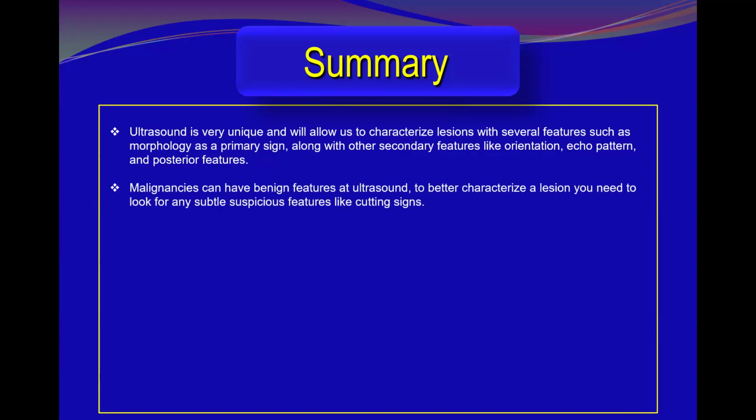Malignancies can have benign features on ultrasound. To better characterize a lesion, you need to look for any subtle suspicious features like cutting signs.